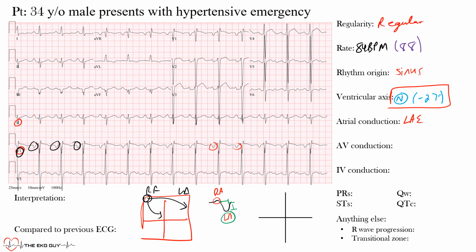And then the other one, in lead 2, by knowing that the beginning is right atrial depolarizing, then the left atrium depolarizing, problems are going to stretch it, and then you also get this M-shaped P wave in lead 2. Maybe you don't see it so much, maybe showing up here, but we already met it in V1. So this is V1, this is lead 2. So that's left atrium.